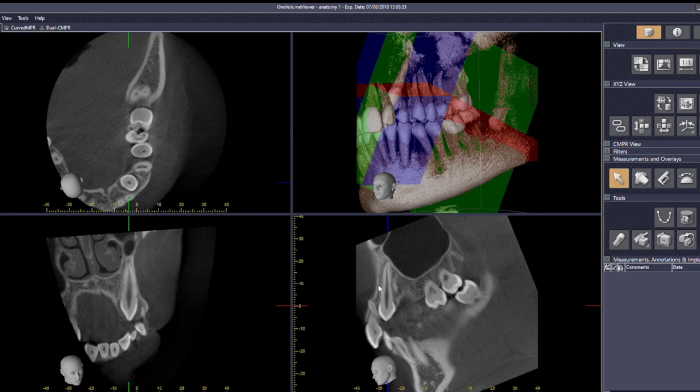If this picture is looking a bit small, there are a couple of tricks. If I just double click the image, so this is my left clicker, double click, you'll get a single picture. And I can expand this up now, go full screen. Now we get a clearer view, and you can see this is the PDL space, which is the black line, and that's the lamina dura, the white line next to it. So we get a really nice view. That's my single image. I'm just going to close that to get rid of it. And that's how you line up a single tooth.